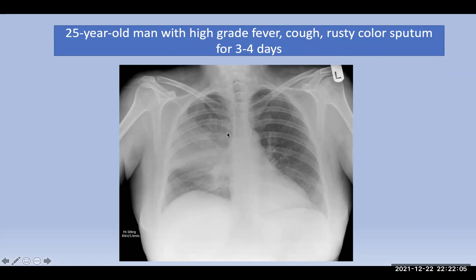Okay, so we have ordered the X-ray and we are expecting findings of consolidation. Of course, it is very unfortunate for the patient, but fortunate for our doctor, for making a diagnosis. So we are seeing in the X-ray a partly homogeneous and partly inhomogeneous opacity in the right lung field. And this is called consolidation. As the trachea is in the central position, of course this is a consolidation.